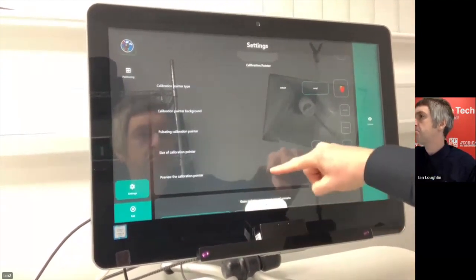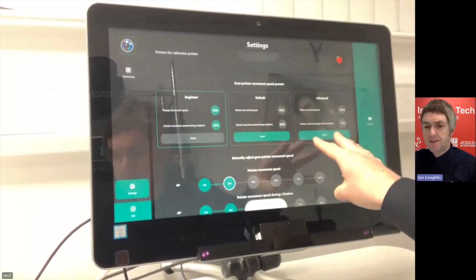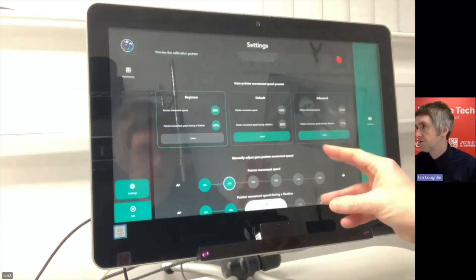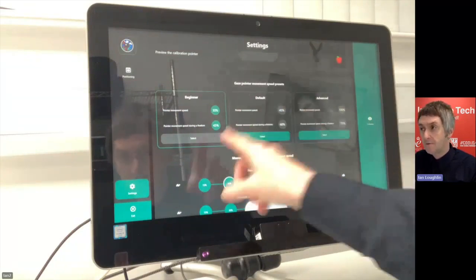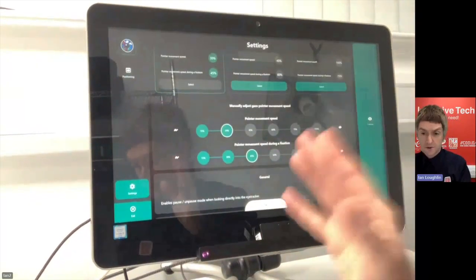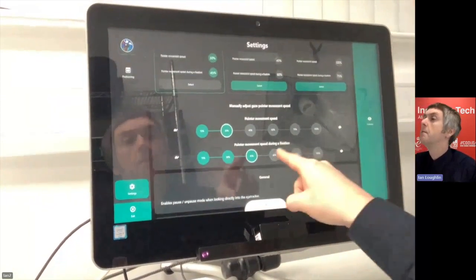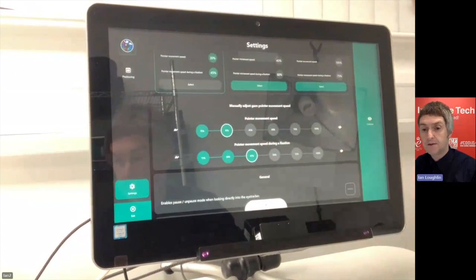Okay. Underneath that, we have the 3-speed presets. So how fast the mouse travels across the screen. So beginner, default, or an advanced. I've got this set to beginner. That's fast enough for me during this demo. If you were finding that was too fast, then you can actually slow it down even further by just adjusting the values manually underneath that.